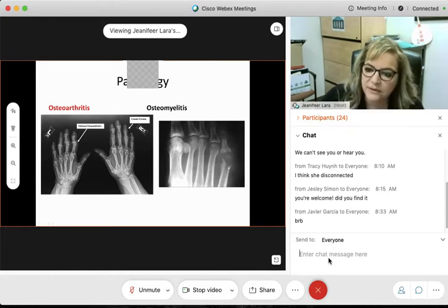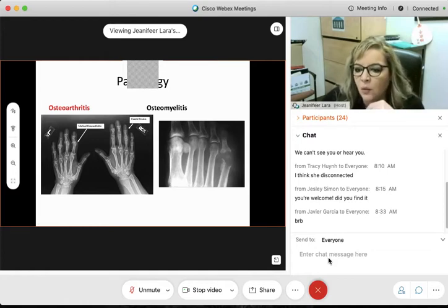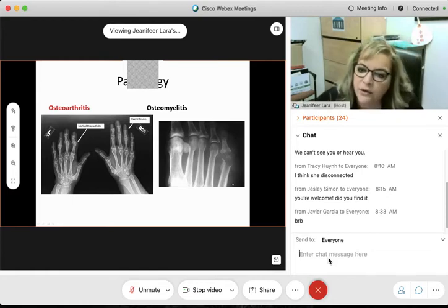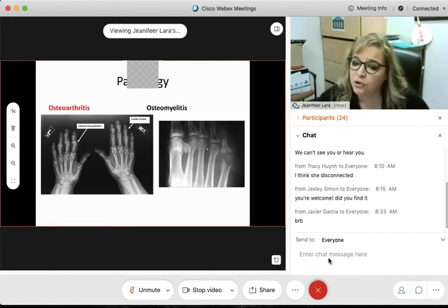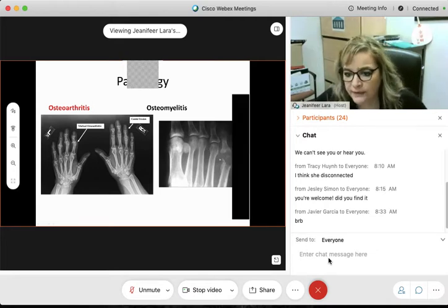It almost gives you a clinical sign that it could be a tumor, depending on what is entailing around the muscle. And it's very difficult to see in this image, but you can start to see some changes in the muscle area. I encourage you guys to go and explore these pathologies and look at radiographs as you become more knowledgeable of what it looks like.